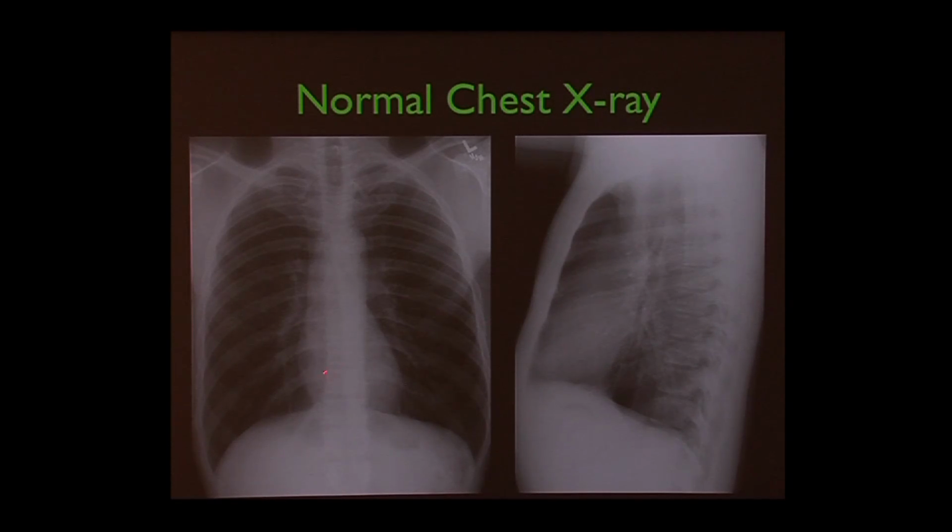We're not just looking at the lungs. We are looking at the lungs all the way down to what's called the costophrenic angles, or sulci, where the lowest part of the lungs might collect some fluid, like a pleural effusion. There's fluid around the lung that would gather maybe down there and blunt that angle. We look at the heart and the size, and we look for things that are hidden by the heart. Maybe I'm seeing a pneumonia back here. I'm not in this patient.